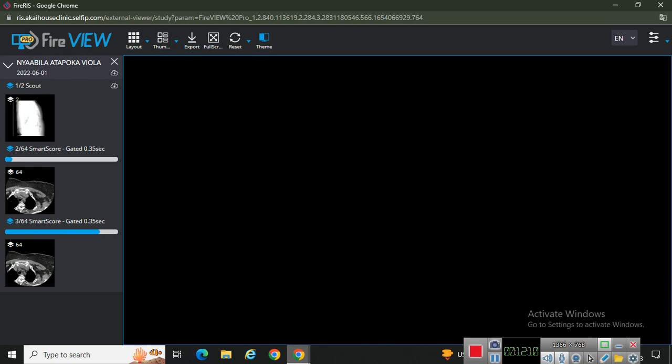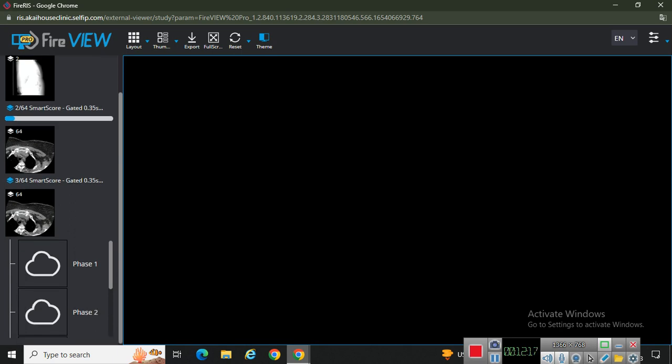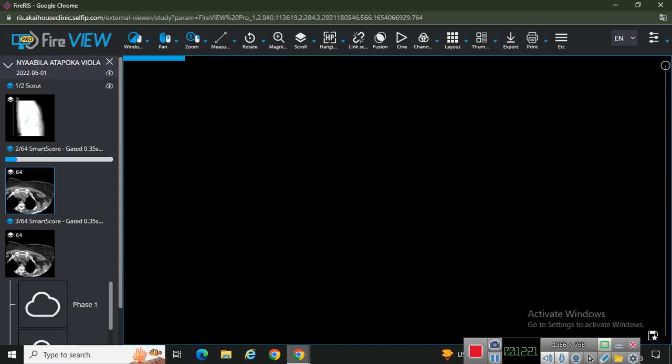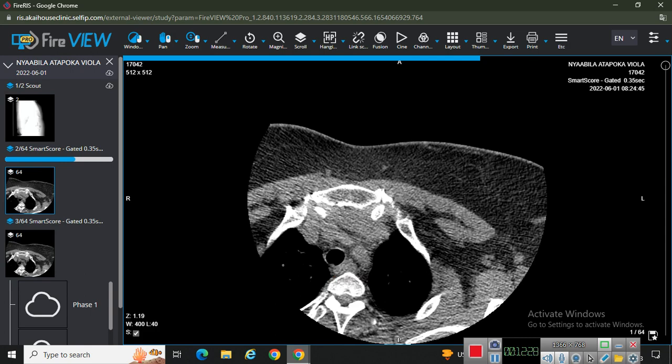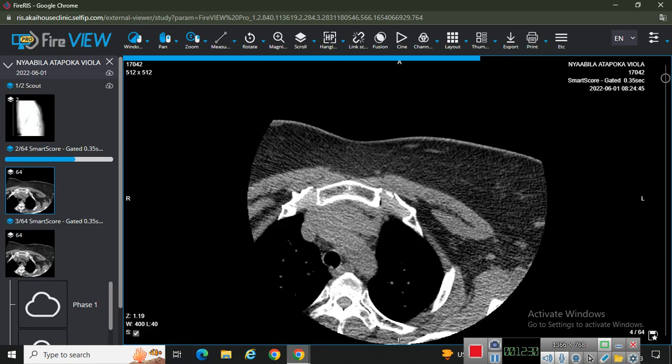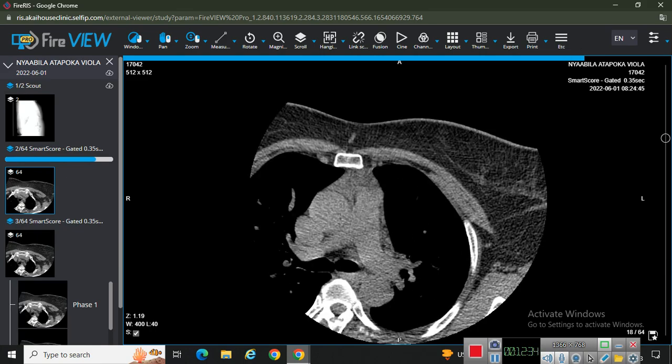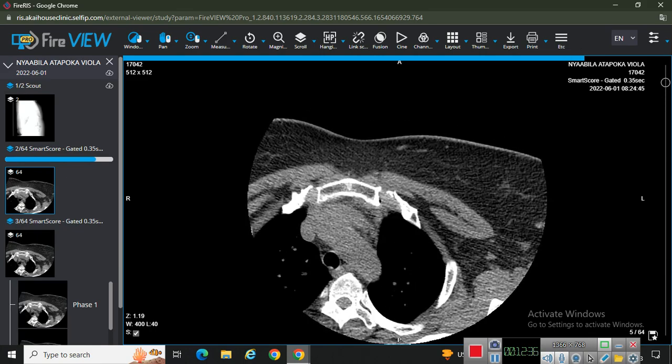Let's see. All right, so I can drag this here. With your middle mouse, you can scroll through the images here.